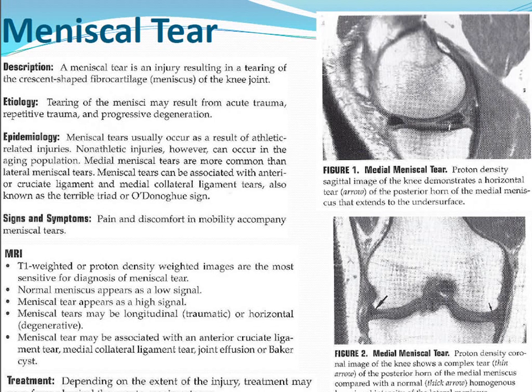So they can be associated with other injuries depending on what the mechanism of injury was, and sometimes they'll know that or be suspicious of it based on physical examination findings, because, say, in the example of medial meniscal tear, the patient will be quite tender along the medial side of their knee, so that's something you can ask the patient. If you have knee pain, where is the pain? They'll say, oh, it's really bad right here, and you can indicate that to the radiologist, because sometimes these can be a little bit subtle to diagnose on MRI.